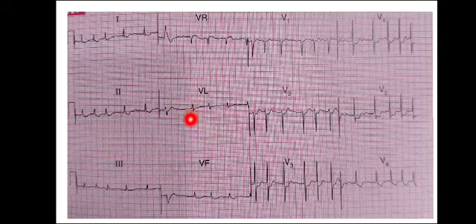And then AVR is normal. AVL में आपको nothing significant. Again QRS कॉम्प्लेक्सेस के अंदर लीड AVF के अंदर भी सब कुछ नॉर्मल मिल रहा है. लीड 1 के अंदर अगर आप देखें तो यही fibrillations आपको मिल रही हैं. बाकी QRS कॉम्प्लेक्सेस नॉर्मल हैं. T waves भी नॉर्मल हैं इसके अंदर भी.